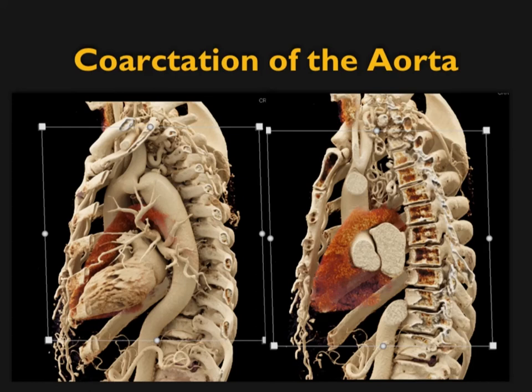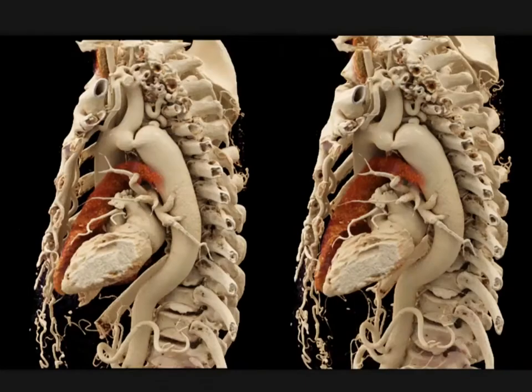We typically think about diagnosing coarcs in children or young adolescents, but often things are just not diagnosed. Look how nicely you see that stenosis, left subclavian artery, just past it. You see the number of views, you see the collaterals nearby. You can see here again, I'm showing you very nicely a relatively opaque rendering, coronary arteries, pulmonary arteries, coarctation just past left subclavian. As is classic, the left subclavian is mildly dilated.